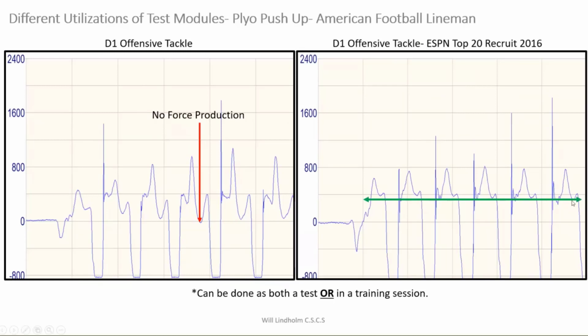Pop, pop, pop. So you can see a big guy like that, it's a pretty significant difference in continuation and consistently providing force to the athlete. And we can do this during a training session as well. I'll just have a run and then do their upper body movement. Then this could be their plyometric movement for their upper body, and we can see how if they're fatiguing out quicker or if they're able to continue with providing that force.